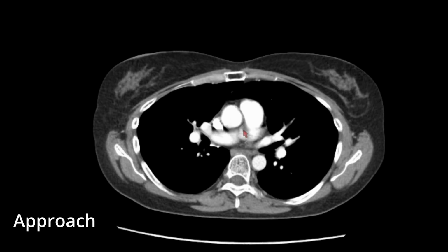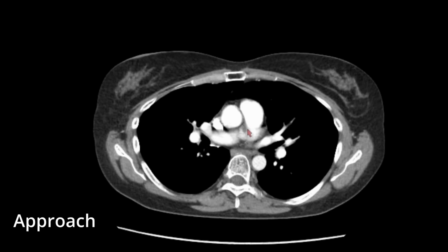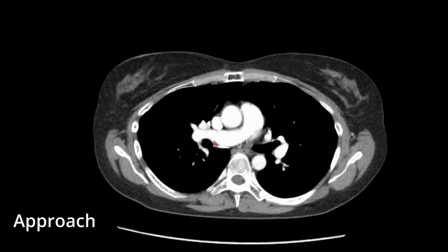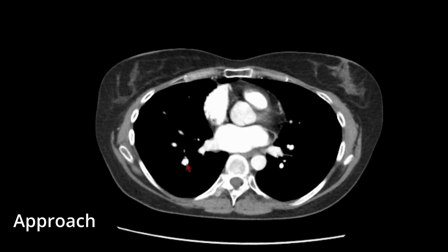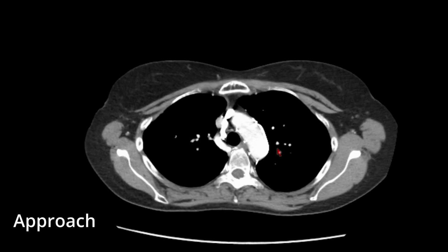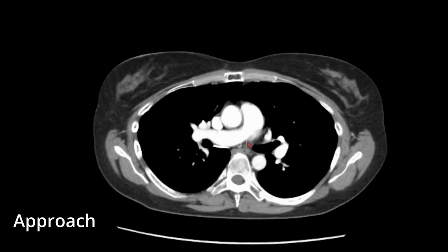Going down to the vessels here, the major vessels, we look at the main pulmonary trunk, and when it is very well opacified, we look for any filling defect in the branches of the right pulmonary artery. Right here there is one, and its branches. Then we trace down the left pulmonary artery, superior branches, inferior branches, and make sure there are no pulmonary emboli.